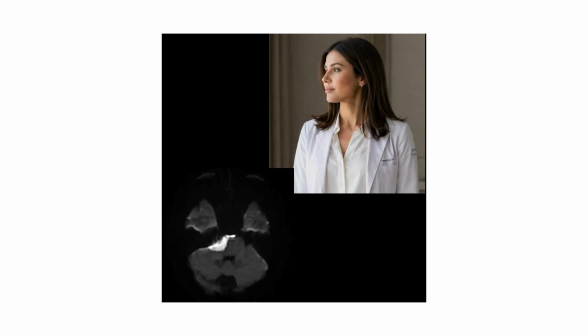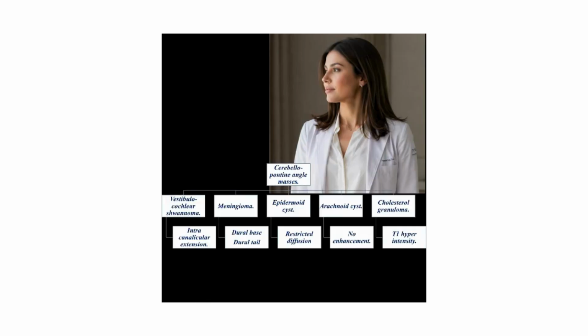Introduce diffusion-weighted imaging, DWI. Show how the restricted diffusion reveals the epidermoid cyst, but if it is free diffusion, it will be an arachnoid cyst. Cerebellopontine angle masses can be summarized in the following smart art. The most common lesion is vestibulocochlear schwannoma, followed by meningioma, epidermoid, and arachnoid cyst. In addition to cholesterol granuloma, the differentiation of these lesions is mentioned in the smart art.